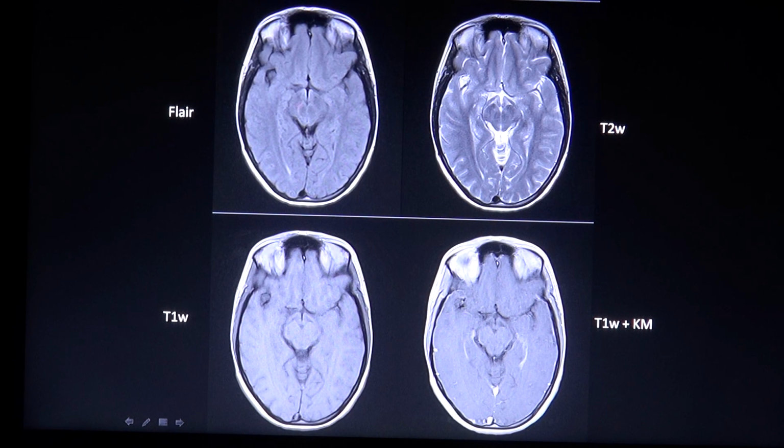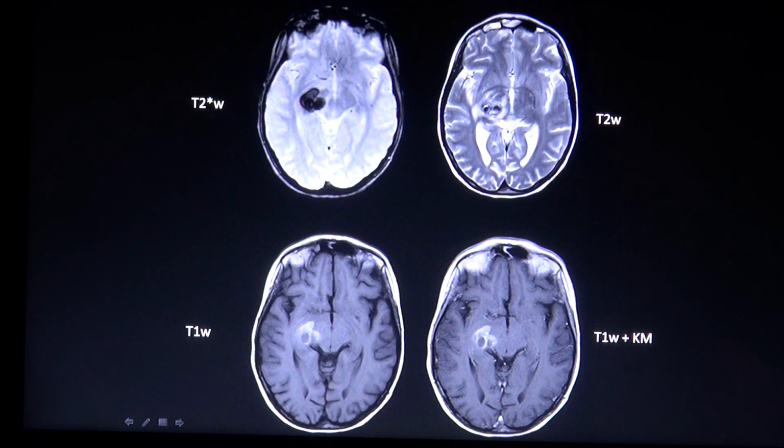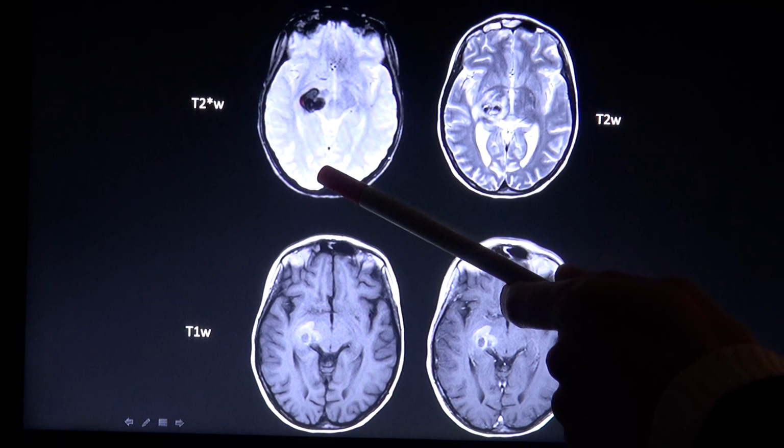In order to differentiate fat or a subacute hemorrhage, you have two options. You can either choose a fat-saturated sequence, so that if the lesion contains fat, it becomes dark, or you choose a blood-sensitive sequence, which is either a so-called T2 star image or SWI, which stands for susceptibility-weighted imaging. On either of the last two mentioned sequences, a subacute hemorrhage would show a black periphery and a heterogeneous iso- or hypointense center. Here you see a T2 star weighted image.